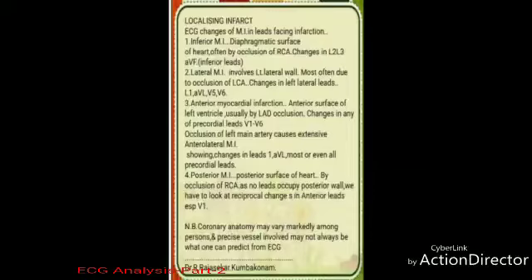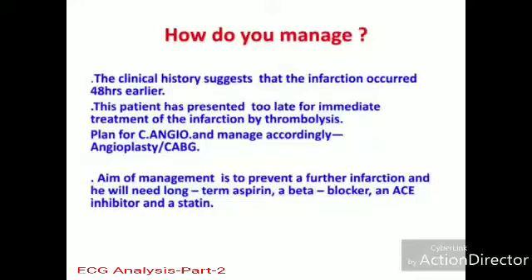We have to note that coronary anatomy may vary markedly among persons and the precise vessel involved may not always be what one can predict from ECG. We have had a bird's eye view of localizing myocardial infarction. Let us see how to manage this patient.